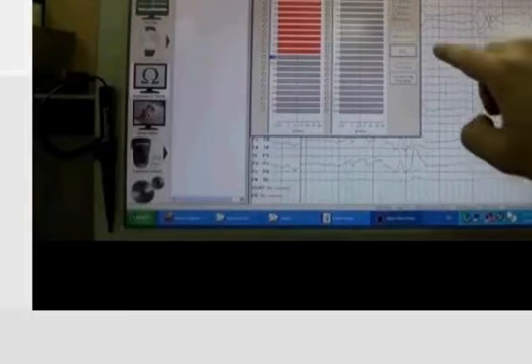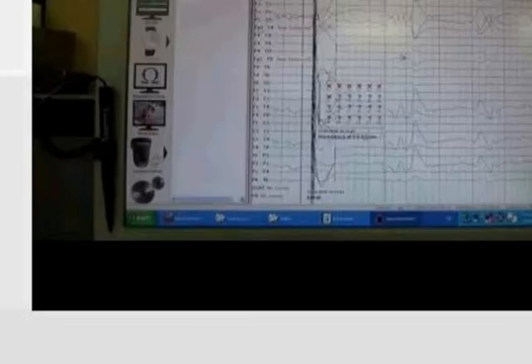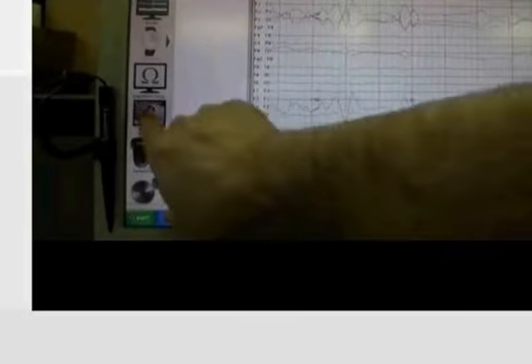On the left-hand side of your window, you'll see some icons. These icons are simply shortcuts that allow you to enable certain functions. So right now we just touch the impedance button, which allows you to do an impedance check. You can click the End button, which ends our impedance. Annotates. There's a video icon that you can use.